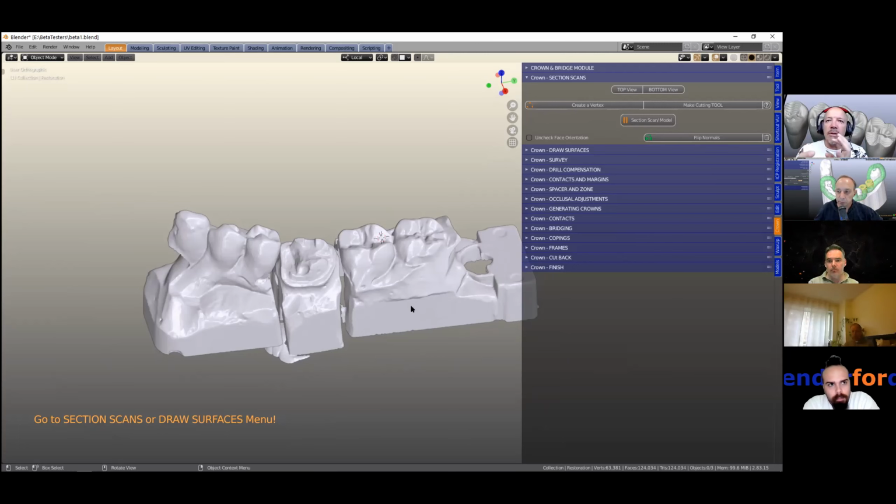But when it comes to doing the contacts, for example, the contacts are a separate model altogether. It's just a matter of individualizing your work. It's convenient, but it's not a must to use that. It wouldn't affect the coding too much. But for example, if you've got veneers and the margins are very close to each other, when you're drawing the margin on the one side and then the other side, it makes more sense having them individual so you can plan exactly where your margin goes onto that veneer.